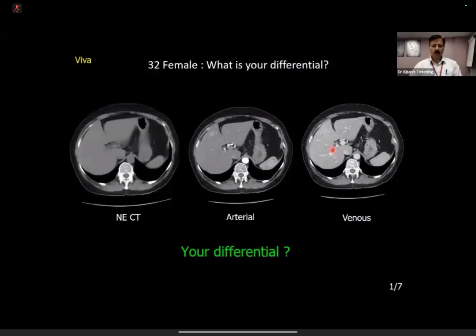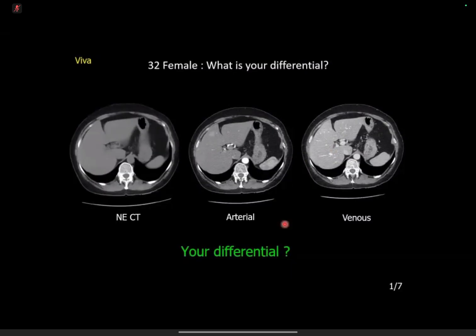Yeah. Now, you have also considered hemangioma there. And why have you considered it? The fact that it's slightly bright on the arterial, but I'd expect a hemangioma would be much brighter, because on the MR, it tends to give us a light bulb sign.